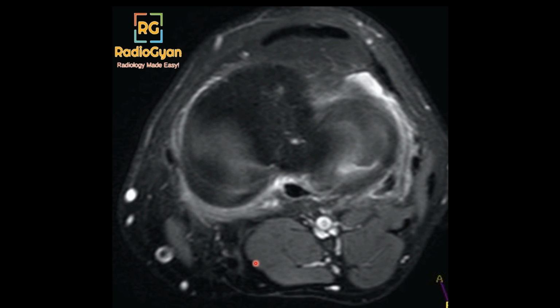Coming on to this knee MRI case, I'll give you some more time because this is an MSK MRI case, which can be a bit difficult for a few of you. I'll describe the anatomy till then. So this is an axial MRI at the level of the menisci. This is the larger medial meniscus, and this is the smaller lateral meniscus. And I would like to identify the pathology in this case.